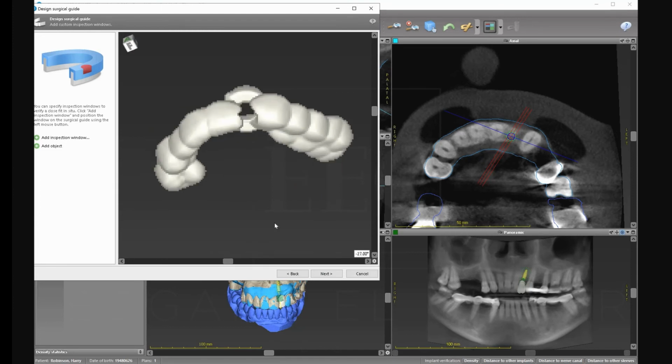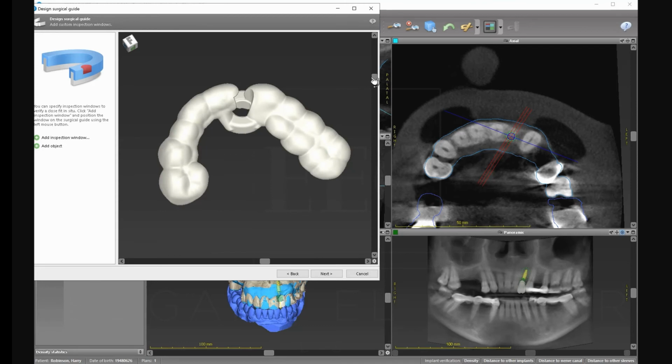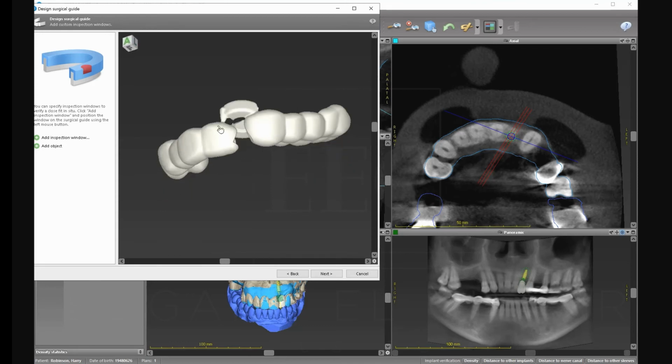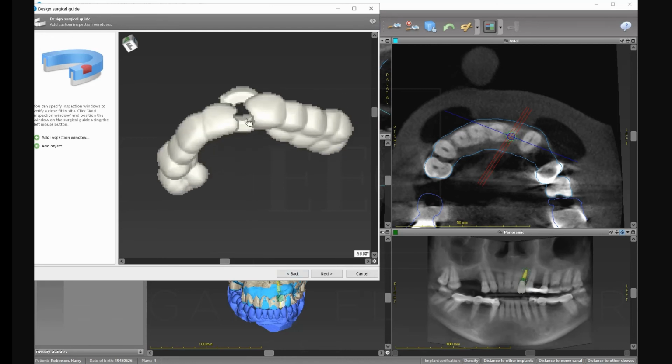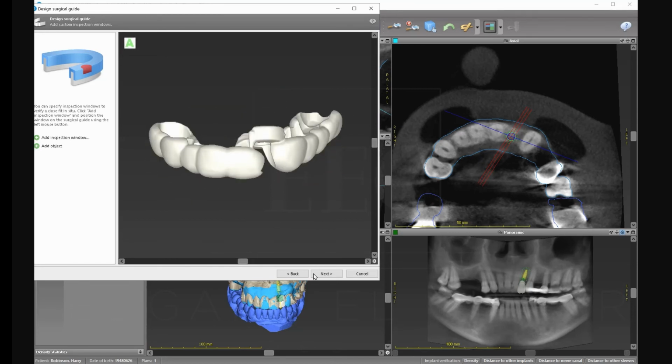So look, this is the problem. Remember, I told you it's going to be difficult, but that's okay. Look at it. You have a good connection here. This is a very weak connection here. That's why we need to... Why can you see it? It did not merge. See that? So what I'm going to do is go back and thicken it even further.